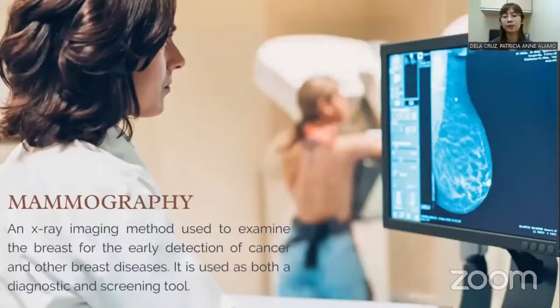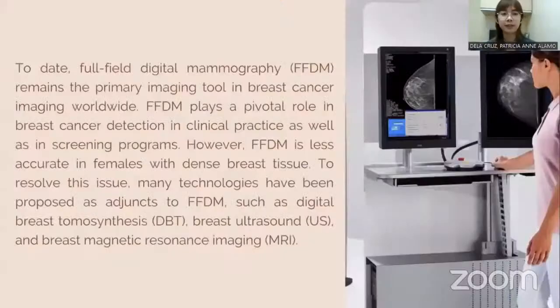It is recommended for women ages 40 and above, but it can be done in patients younger than 40 if they have a family history of breast cancer, or symptoms like palpable masses, nipple discharge, or any pain in their breast. Full-field digital mammography remains the primary imaging tool in breast cancer imaging worldwide.